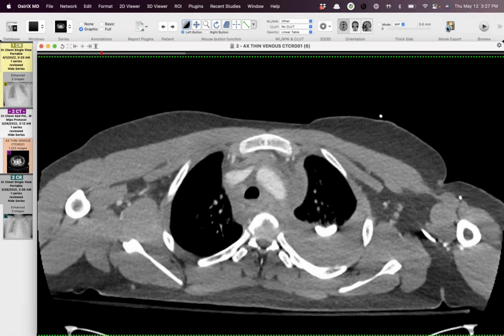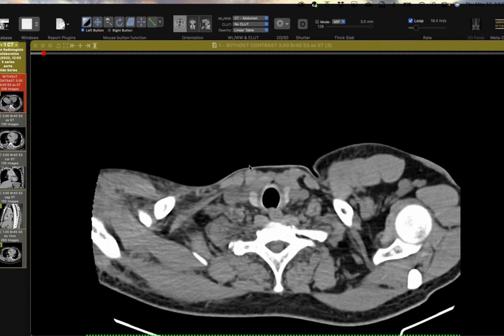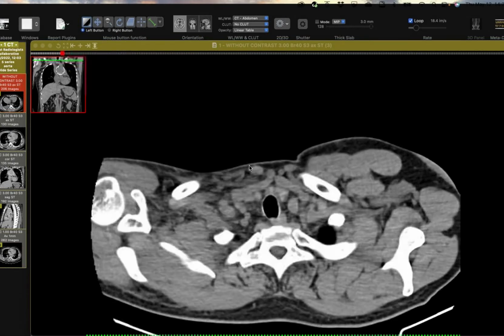So, all right, Jeff, I can pull up one more if you want to go. Yeah, I'll show this one. So this is a youngish person who I don't remember the history exactly, but had a chest radiograph for a reason, and they saw a mass, so they did a CT scan.